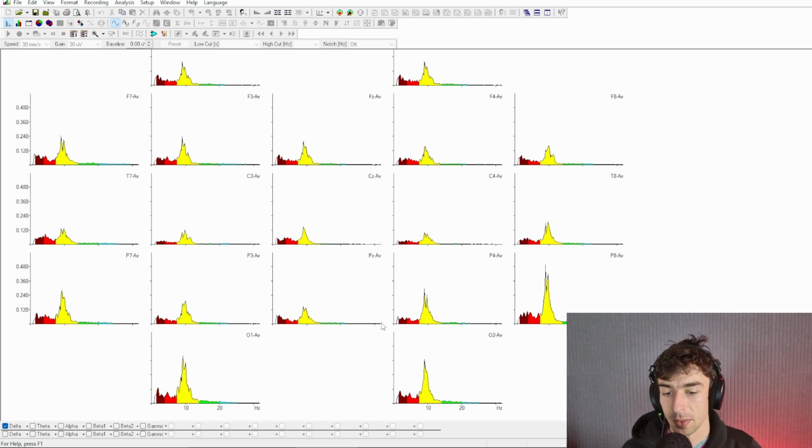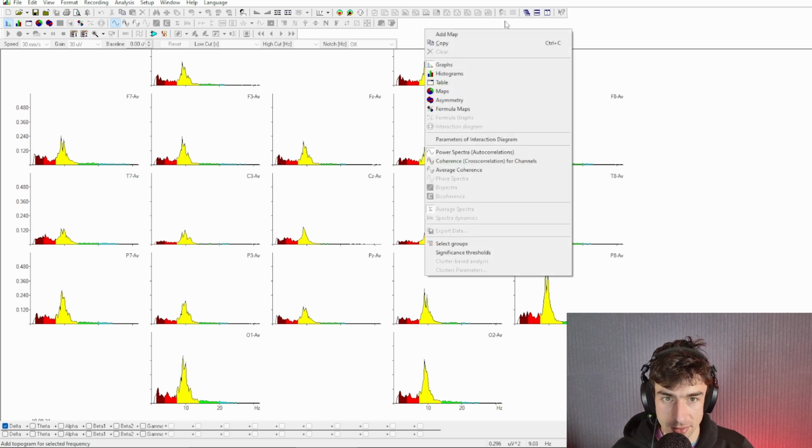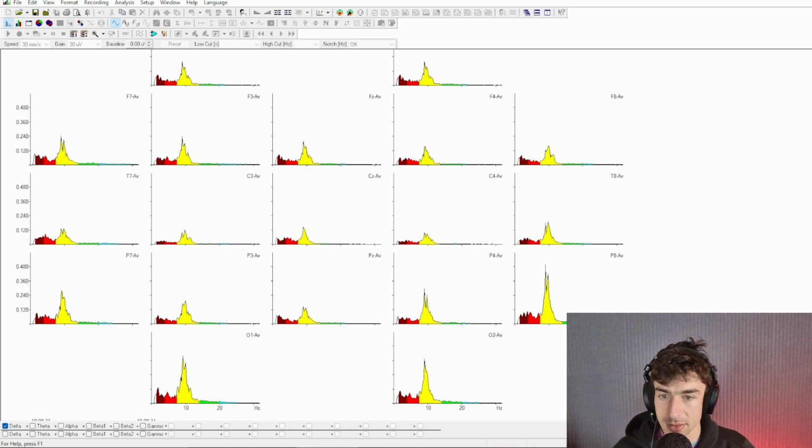So what do we pick out from this when it's so jagged? Well, hard to say. I mean, earlier on I noted that there was some of this frontal kind of slowing activity, so we could generate a map for that. And we can generate a map for the slower edge of alpha. Looks like that's a pretty consistent feature around 9 hertz. And then we can pick up this faster edge as well, which is closer to 10.